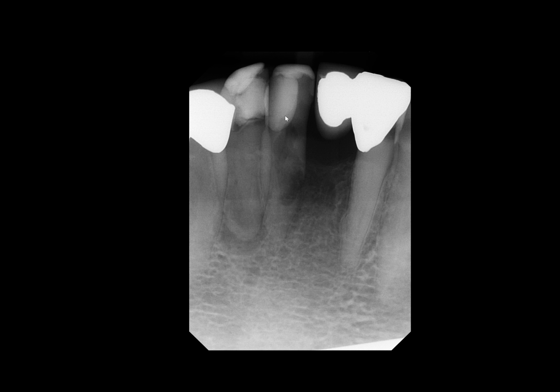First of all, it has rather large restorations in the crown and perhaps the margin, right? Looks a little suspicious. It doesn't look very good, but it's a very large restoration. I think we can all agree on that. And then let's now look at 25 first.